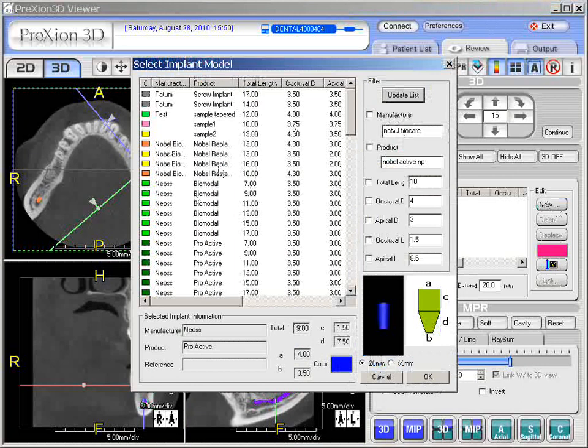Now remember, you can have your own library here. We have discussed this in another tutorial video where you have the implant editor icon from your desktop, and there's the tutorial video called implant editor library. So you can review that and how to create shapes. So we won't get into that at this point. We just assume we've already created the shapes we wish. And this is just a token library that we use and sometimes give out as complimentary. But it's not a full complete library, but it has various sizes in it, especially for what we're using here. It's for good demonstration purposes.